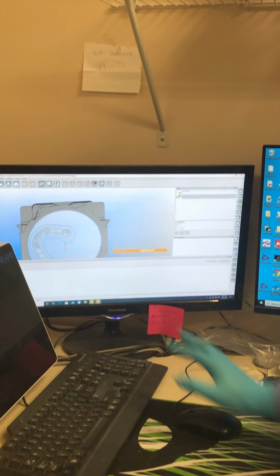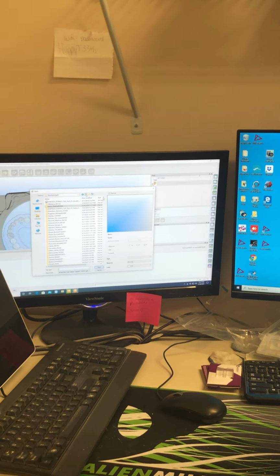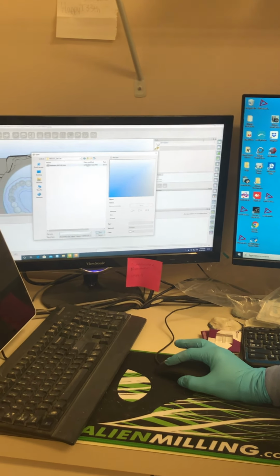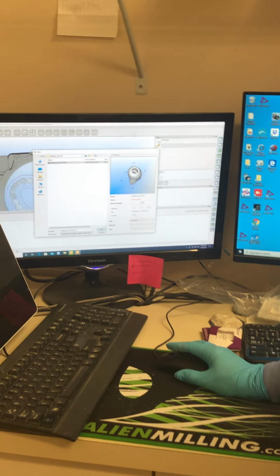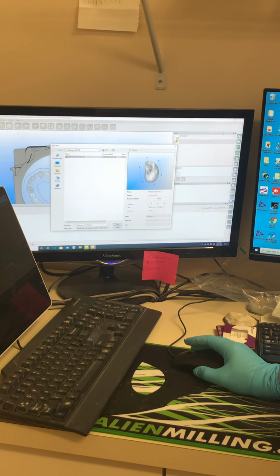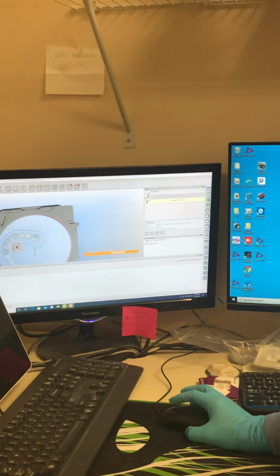What I'm going to do is go to this icon and say load part. I go into the library that came from the design software, click on the last one, open, and click on it again. It gives me a preview of how the tooth is going to look after it's milled. Beautiful. I mean, look at this. This is a beauty, and I know it's going to be perfect. I just know. I'm going to click open, and it opens in the disk. You see, it's already there.